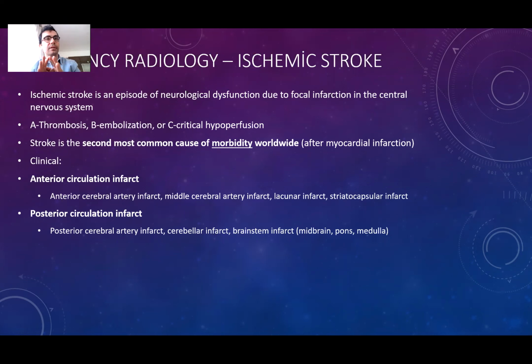So in case of emboli, like we have seen, when there is a thrombus inside the artery, we can see territorial infarcts. When thrombosis happens in the venous system of the brain, can it cause ischemic stroke? It can cause ischemic stroke as well because of venous ischemia.